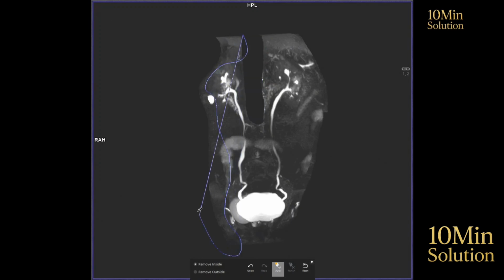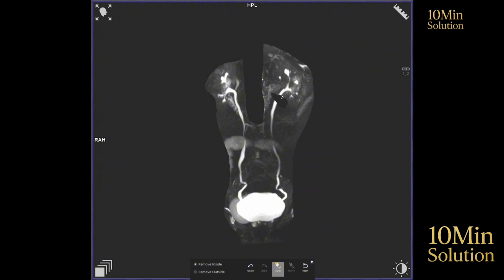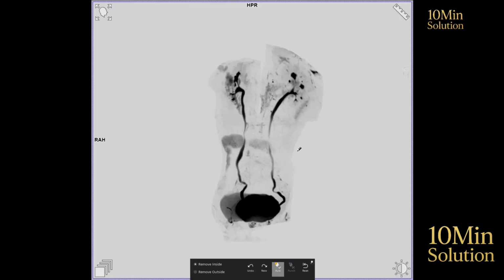And look, we have to work very carefully. Because if this ever gets cut off for us, let's say you accidentally cut it here, how will you bring it back? Here, there's this undo option. If you press it once, it will return to its previous state. I pressed F10 on the keyboard to do this. I just made the change.